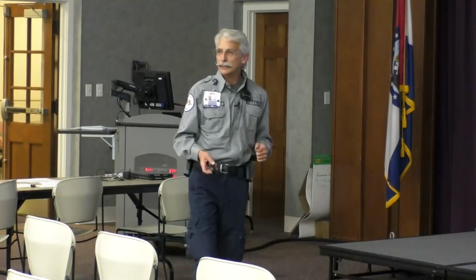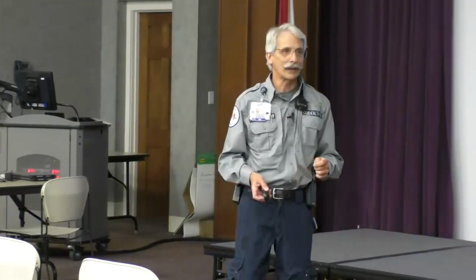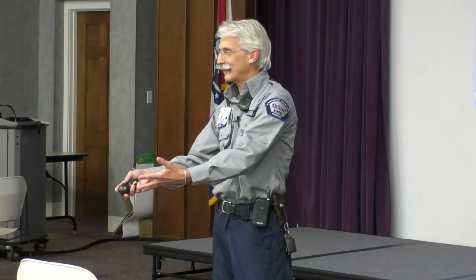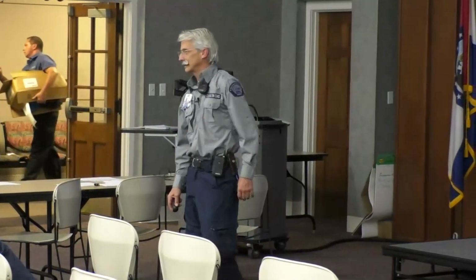When you call to the hospitals, do you call and tell them they're having an inferior lateral? They don't like that, do they? No, then they start with what leads are doing what. So just start with what leads have the elevation in them. 2, 3, AVF is elevated. Yeah, 2, 3, AVF and V5 and V6 are elevated in this one. Absolutely, with reciprocal changes. And if they really want to know the reciprocal changes, I guess they can ask, and I'll tell them.